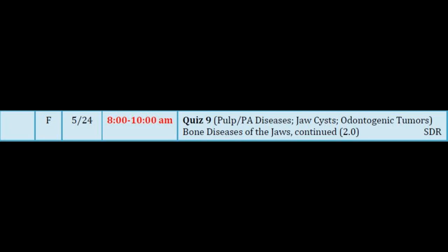That's the only time you would have a suspicion that you're working with ossifying fibroma. So, is this lucent, opaque, or mixed? It's a pure lucency. It's well-defined. Teeth are vital. Has a little bit of a sclerotic rim. There's some increased density around it, but it's not the thin, white, corticated line. But there's nothing about that should make you be suspicious. It's ossifying fibroma. So I don't want to see that on your differential, even though when it was removed and examined histologically, that's what it ended up being.